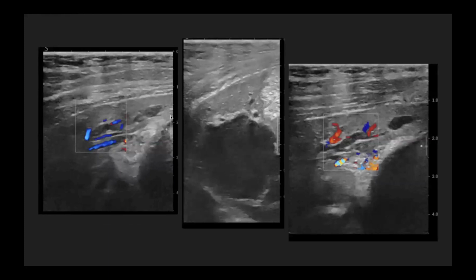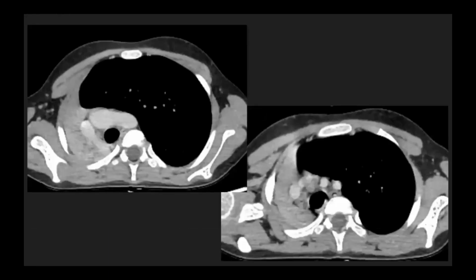A color Doppler would delineate that better. So these are the bronchi filled with fluid, a fluid bronchogram, with parallelly running vessels here. That implies this is a collapsed lung. And central to that collapsed lung, what is there? There is a mass which is seen with a definite, distinct, different echogenicity from that of the collapse. Subsequently, CT was done.